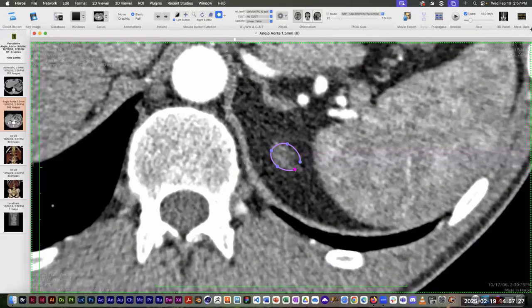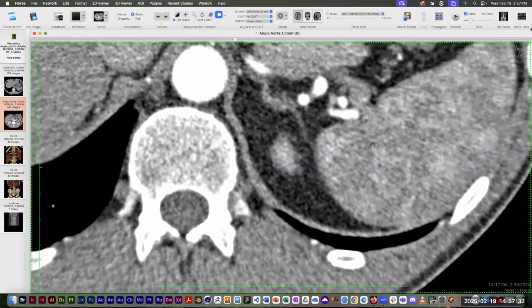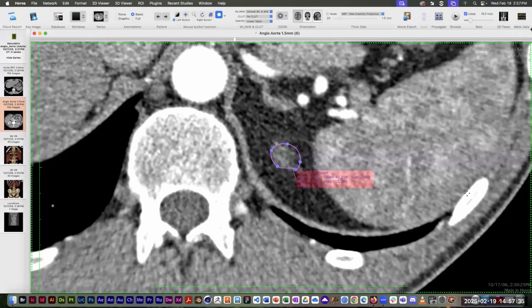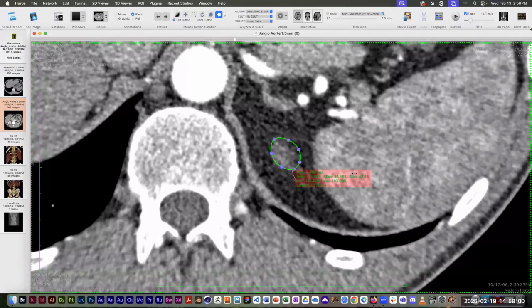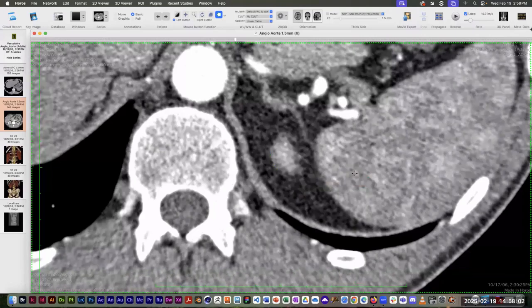I'm going to click here on the starting point and it creates a closed polygon. But now I'm going to go to my next slice and then come back to that. And you see how it's all of a sudden just mysteriously distorted that point? I'm just going to delete that and try again. So don't even click back on the starting point. You can get close, but just leave it open and it will automatically close it. And if I come back to it, see, it's closed and it didn't kink the line. It's a very strange behavior.